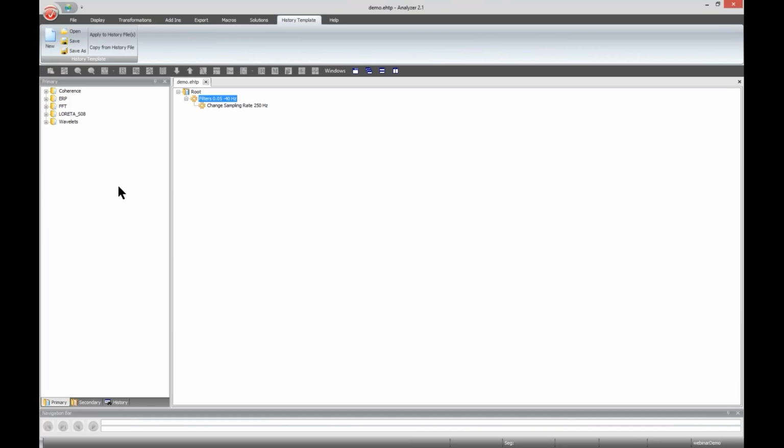And just a note, all processing pipelines shown today are examples only and can look very different in other cases. Unfortunately, there's no such thing as one standard pipeline for a method. I open the history tree, the processing pipeline for ERP, by right-clicking on the book icon and then expand all.